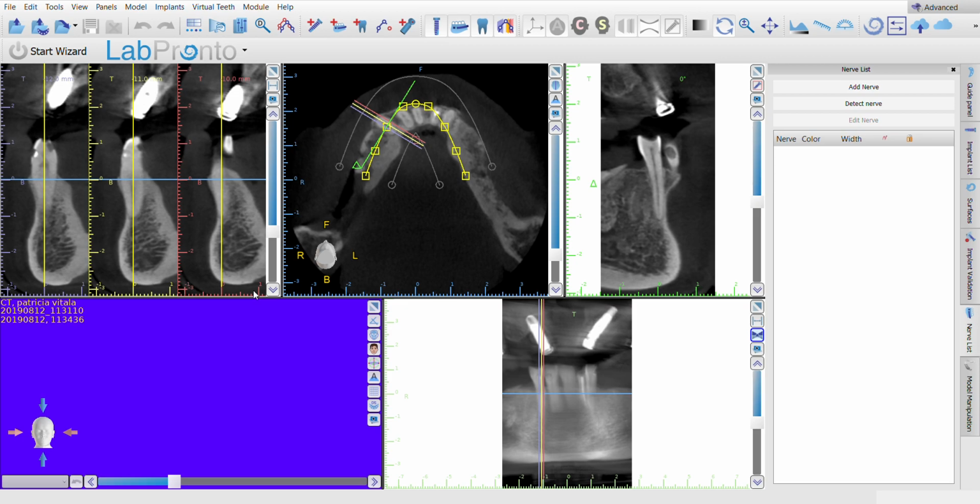Now this particular window allows you to start eliminating areas and parts of the CBCT that you are not interested in. The reason is, if you're not interested, you could delete those sections in order to run the program smoothly, to avoid keeping heavy documents on your computer and cluttering your computer for absolutely no reason.